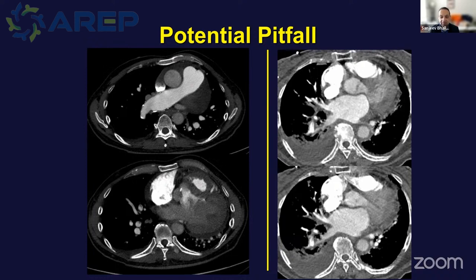So this is a patient who has congenital heart disease. You may see that there's an overriding aorta in a patient with a history of a previous tetralogy of Fallot. Big bronchial arteries, which we don't see here, but you can see that the bronchial arteries anastomose with the pulmonary arteries, and their flow will be seen anteriorly in the lower lobes.